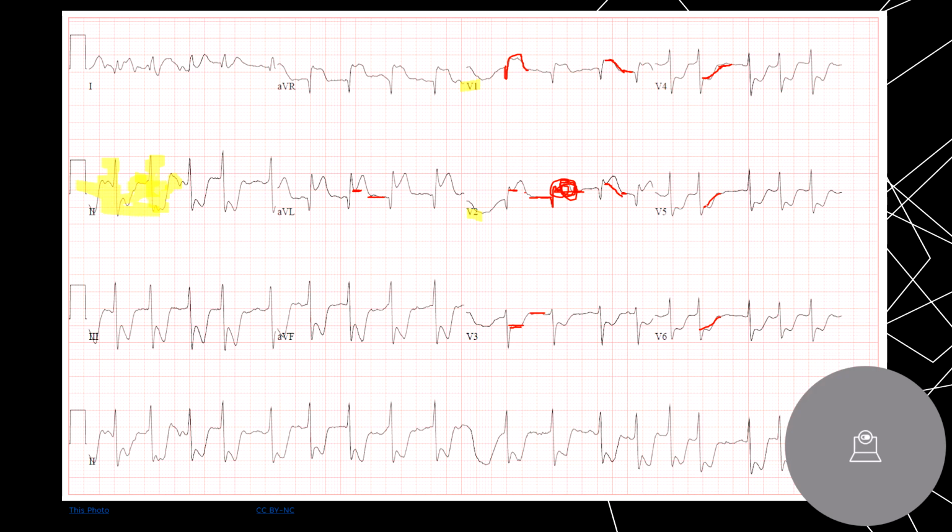Okay. So let's go QRS, QRS, baseline, T wave. Actually, this is J point here. So you have huge, huge depression. Okay, again, this is deceiving because look, you could think like this whole thing could be an S wave. You're right. If this was the only thing I had to look at, I might actually believe that. Like here, this is a T wave. This whole thing is S, which happens in bundle branch blocks.